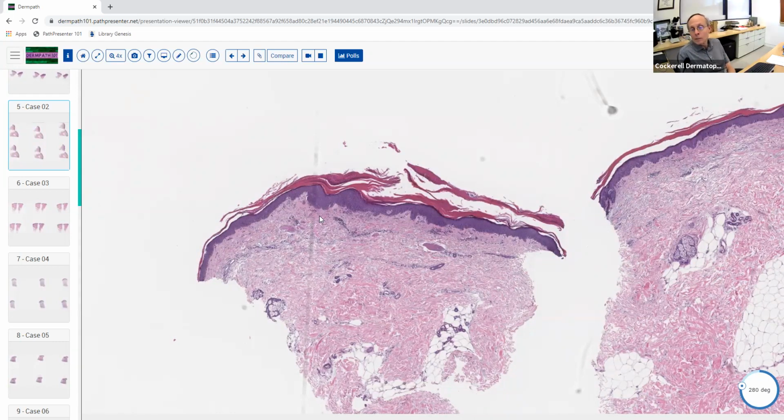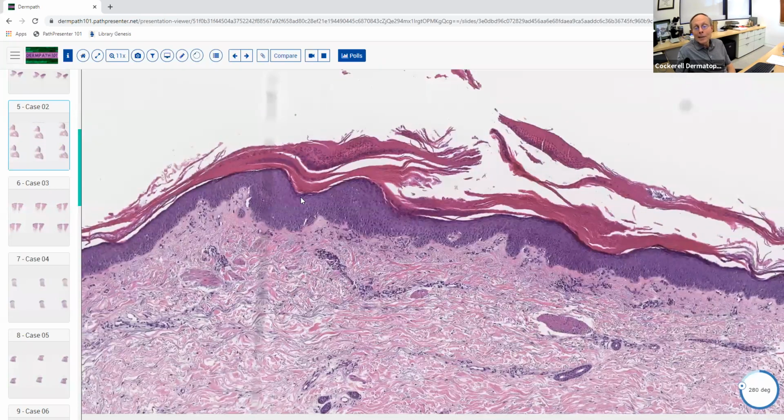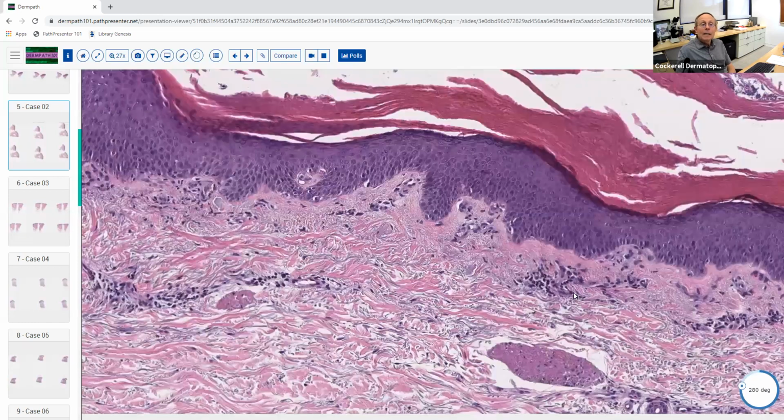And clinically, you'll see the spines, and you rub your hand across their skin, and it feels like you're rubbing across a nutmeg grater or a Nestle's Crunch bar, that sort of thing. So that's characteristic. And if you look inside the actual cornified layer of the follicle that's got the spine coming out of it, it's got that same kind of ortho and parakeratosis. So if we cut deeper, maybe this is at the edge of a follicle, you'd see that same kind of parakeratosis in there. The inflammatory infiltrate in PRP can be variable.